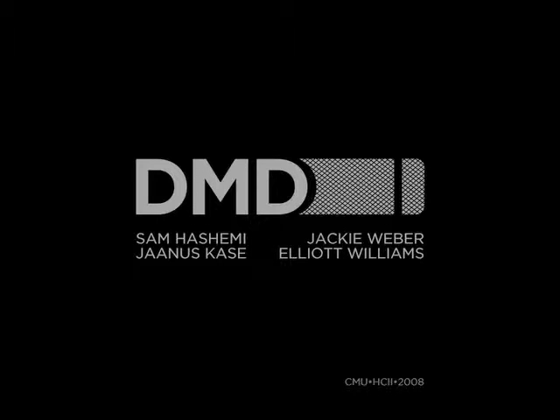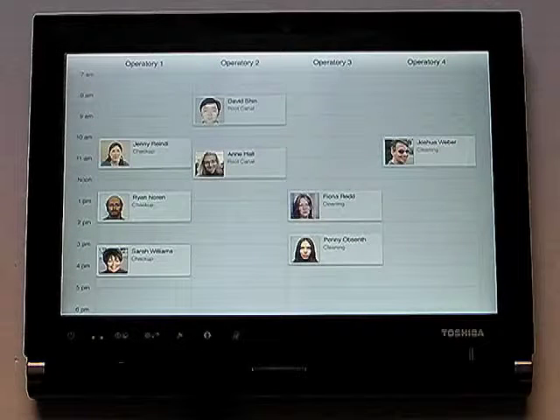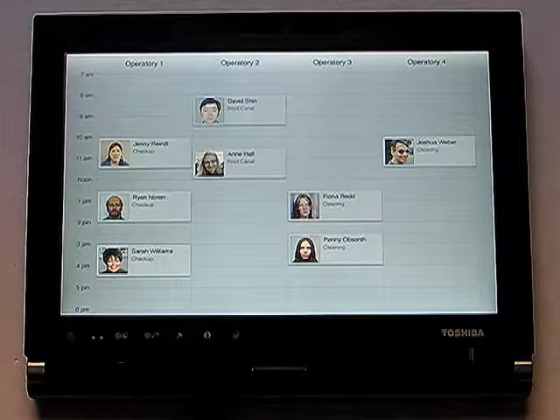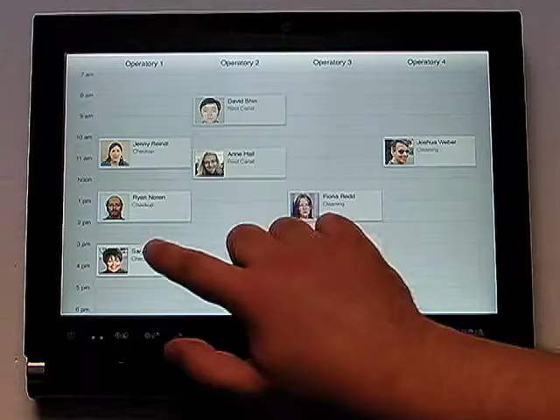I'm going to show you our prototype dental system, DMD. It's designed to let dentists review lots of information about a set of teeth, plan a treatment, and educate patients. So with that in mind, let's take a look at how it works. My patient today is Sarah Williams, who is already in the operatory. I arrive and use the schedule to find and open her record.